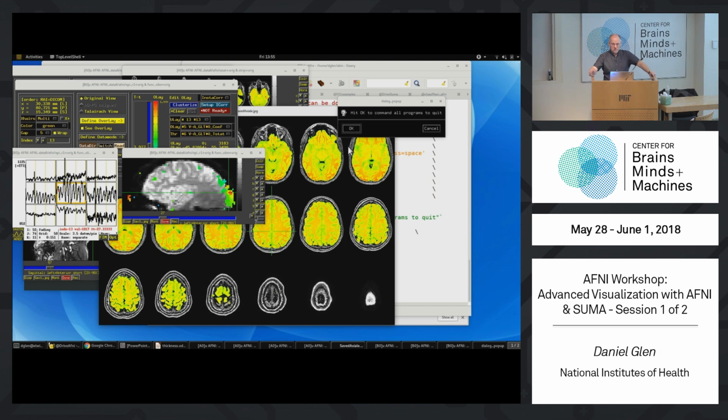So I have 45 subjects, and we do this then for every subject, or we can run it and have it not display, but only save the JPEGs and look at the JPEGs. Yeah, so you can do both, right? I mean, it depends how much time you want to dedicate to it. We have procedures for doing both these kinds of things.